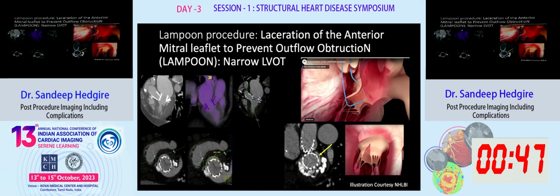I want to say a couple of things about when patients have more than one valve that needs fixation and they are not operative candidates. Please note that there is only so much space available in that LVOT area. When you place two valves there, there's barely anything left in that space, and as a result, sometimes you have to lacerate the leaflet to maintain the blood flow across the LVOT. But when you do that, the patients are prone to develop a paravalvular leak, which is what this patient had.